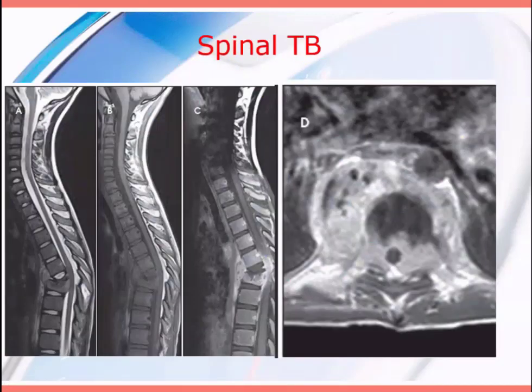Another case. We will now discuss spinal cord infection. Very important, at least in Egypt, is TB. We have Pott disease. Here we can see that there is a fracture of the bone without affection of the disc, and there is an epidural anterior spinal sheet of caseous material, and we have an epidural abscess also encroaching on the spinal cord.